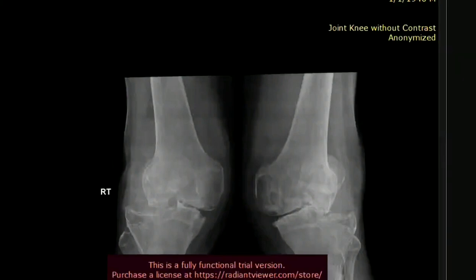Frontal radiograph of bilateral knee joints, in which I can see only mildly reduced bone density, but it isn't specifically localized to the periarticular areas. I can also see mild subluxation along the bilateral knee joints with genu valgum deformity, and significantly reduced joint space along both compartments, medial and lateral. There is significant periarticular sclerosis with loss of epiphyseal height and wedge-shaped defects along the epiphysis on both sides, predominantly along the lateral compartment. There are no significant osteophytes.